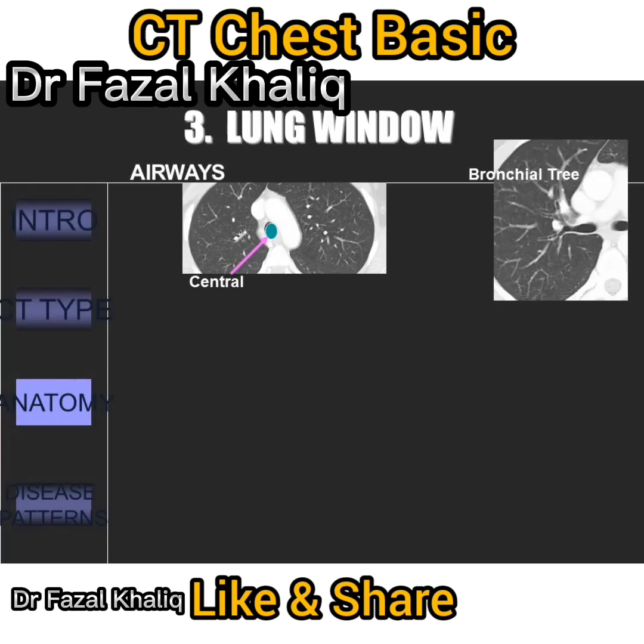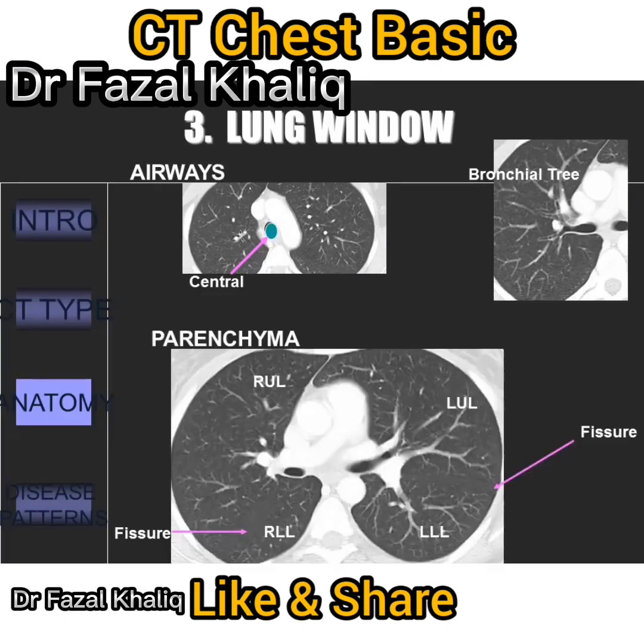Next, we look at the right bronchial tree. Of course, we would then move to the left side of the bronchial tree. Both times look for anatomic variants, mucus plugs, airway collapse. Look to see that the airways do indeed taper. Last, we'll look at the lung parenchyma.